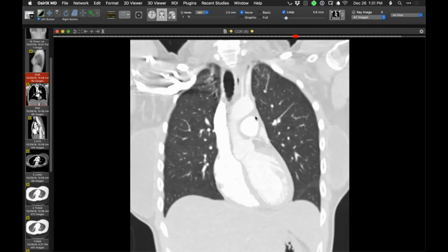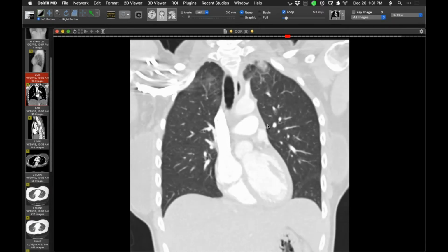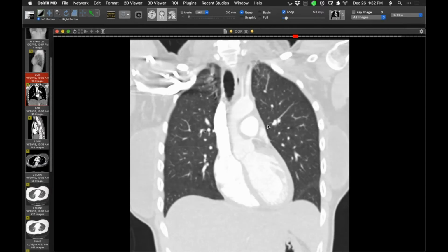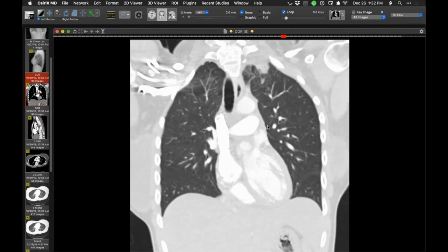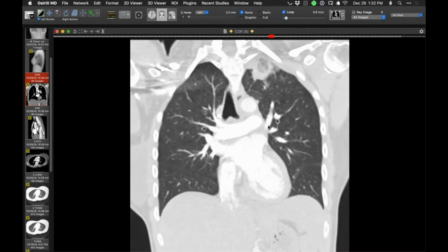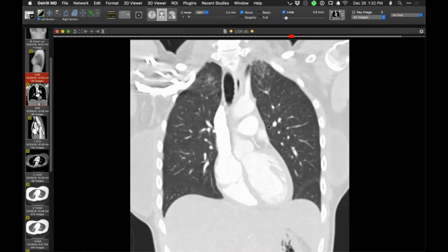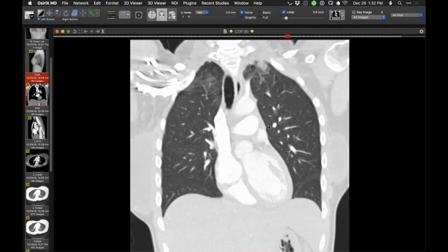I'm just curious. I think it could be localized inflammation, increased lymphatic drainage, and maybe have a lot around areas of infection. And actually, I think that can be a very helpful finding. Yeah. Got these shaggy margins. Like if you think of septic emboli, especially when they're fresh, they're very shaggy around the edges, unlike, say, a cavitary metastasis, which tends to be very clean.